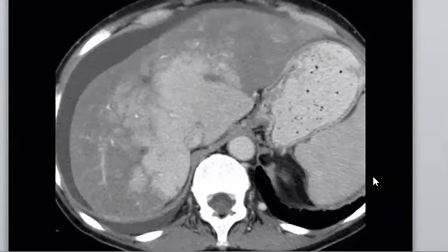And it is obstruction of which vessels? The hepatic venous outflow. It can happen at the level of the hepatic veins or in the IVC. Then you can see central, then peripheral enhancement, like this appearance, which has different densities, right?